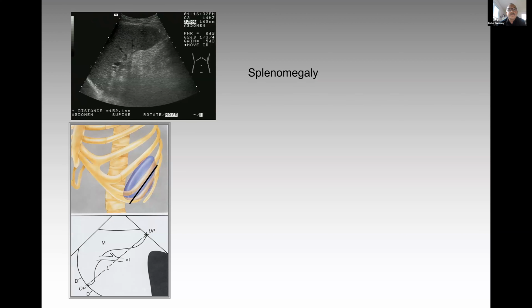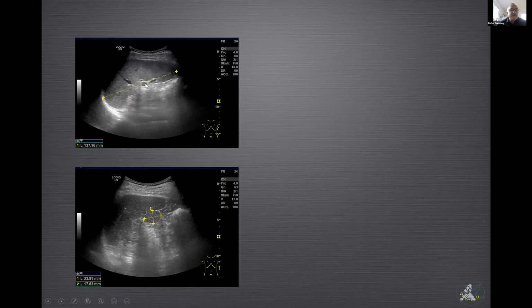The main important findings are the splenomegaly. And they also gave us the information what to do then. The next are accessory spleens, like you can see here in these pictures, most often one, but also sometimes more than one. We know from other studies by CT and other imaging methods that we can see them very often, nearly in 4 to 7% of all of our patients.